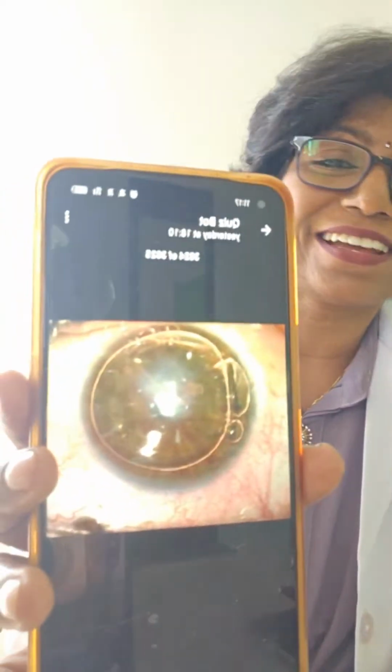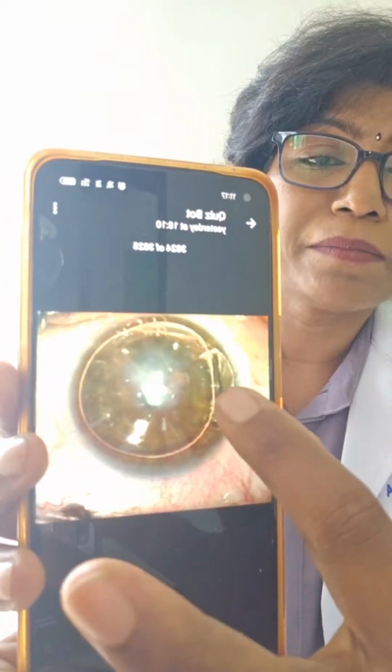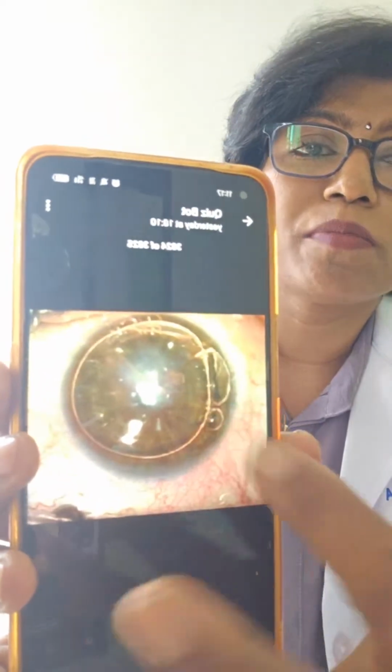Now next question. Okay, look at this. There is a main air bubble and there are two bubbles here. Let's see what exactly is the question. The image shows penetrating keratoplasty, intracorneal ring segments, intracameral SF6 pneumoretinopexy.